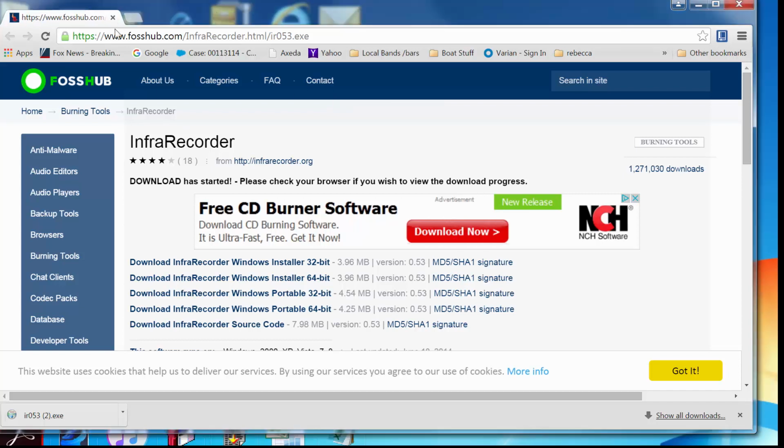I created this video to teach people how to create ISO images of their MRI studies to send to the doctor in another country if you're getting an evaluation done overseas.